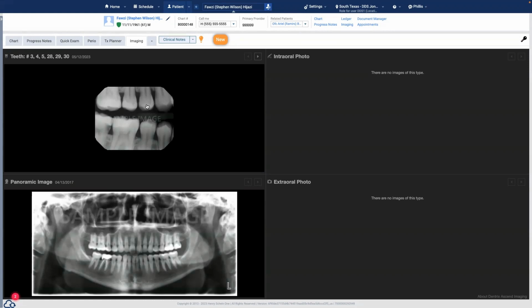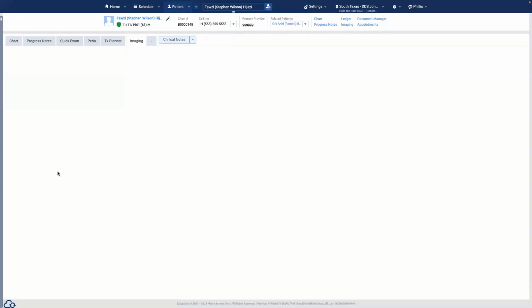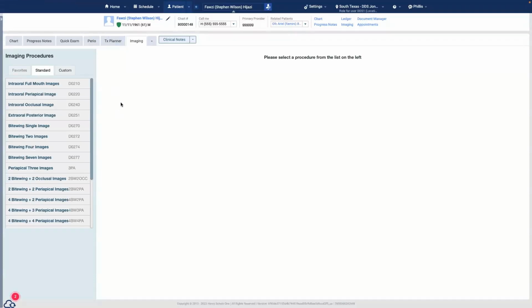Yeah, this is kind of important to stress as well, because I do a lot of beta testing for different companies. In my 7 ops in the office, we literally have 6 different sensors. And the beauty of Dentrix Ascend is that it's basically like a drop-down menu. You pick different sensors and boom, it directly integrates. And now, yes, if you can go ahead and click that, if you can show people, this would be again, like you said, we're in the same thing. I didn't open up to a new area.